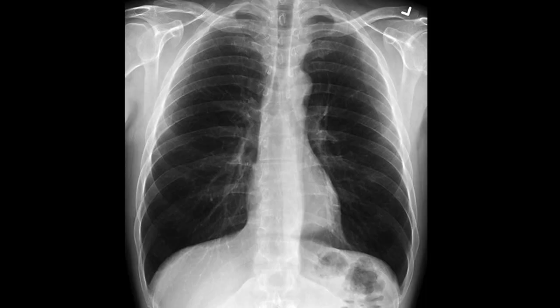The third part of the airway is the hilar structures. Focus on the X-ray here and you will notice that each hilum is a place where pulmonary blood vessels enter or leave, and the major bronchi of course enter. Each hilum also will have a collection of lymph nodes, but these lymph nodes will not normally be visible. The left hilum is often slightly higher than the right, and this is absolutely normal. But remember, both hila should be of approximately the same size.